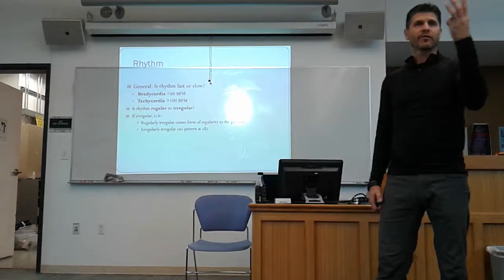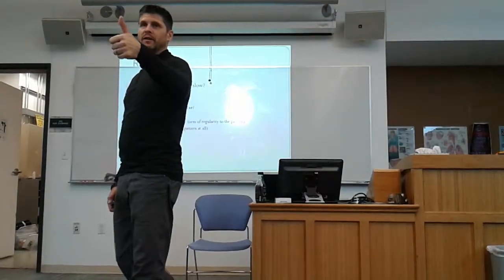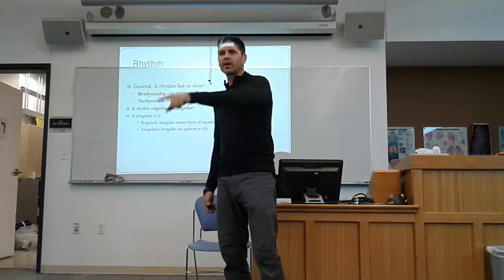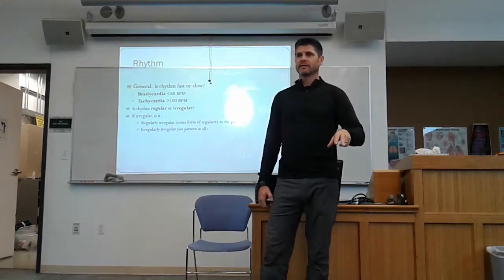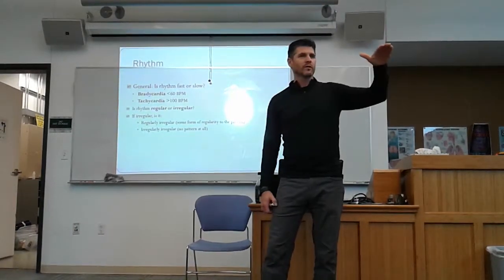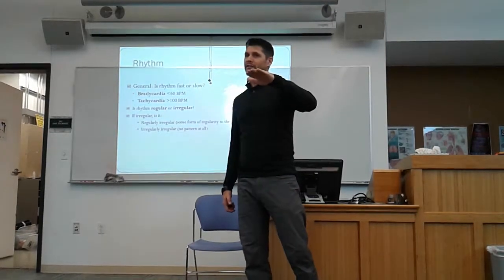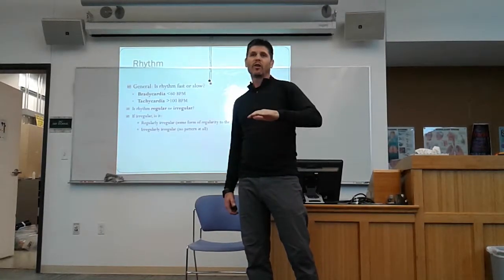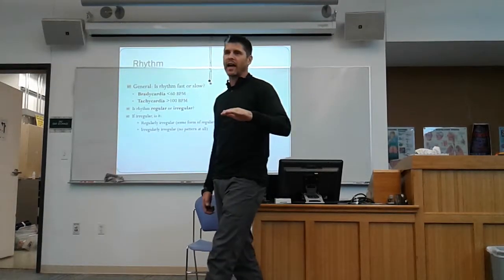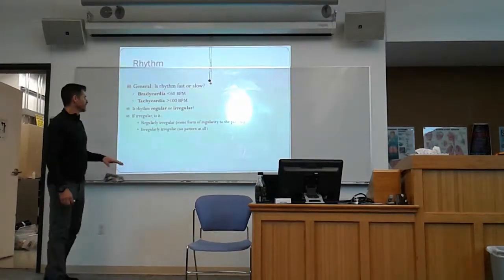So that breaks it down into three possibilities for my rhythm. Completely regular, a regular irregularity, or an irregular irregularity. Completely regular, completely normal. Not normal, but with a pattern. Not normal, and I can't find any sort of rhyme or reason to why it's abnormal. Good? Looking at all those.